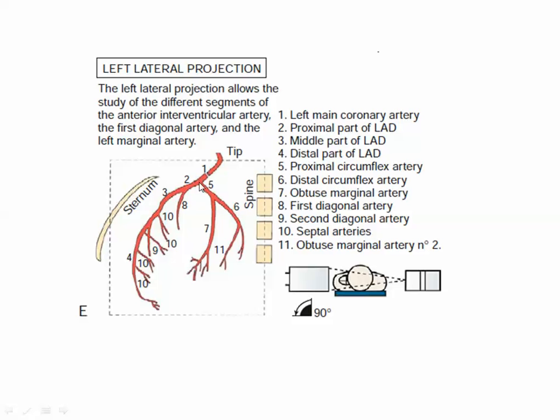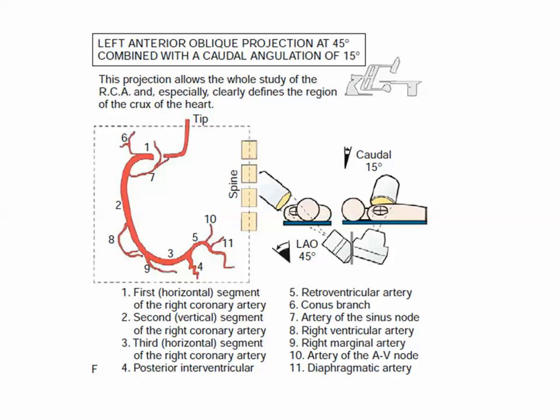Okay, what's the proximal LAD? From the ostium to the first diagonal. Yes, from the first diagonal to the second diagonal, it is the mid LAD. From the second to the third, and distally will be the distal. The proximal LCX is from the ostium to the what? First OM. From the first OM to the second will be the mid and then the rest.